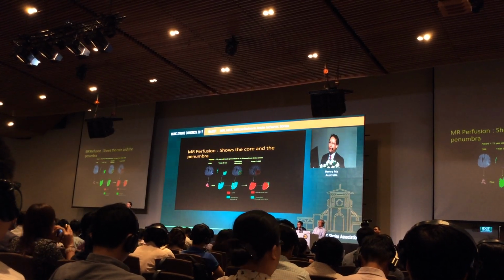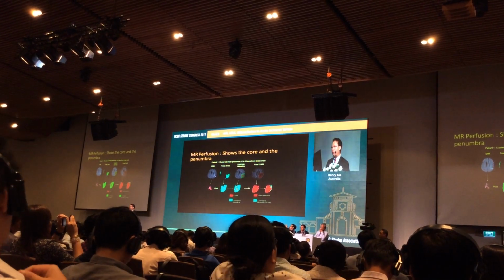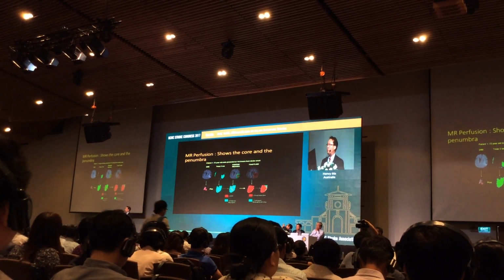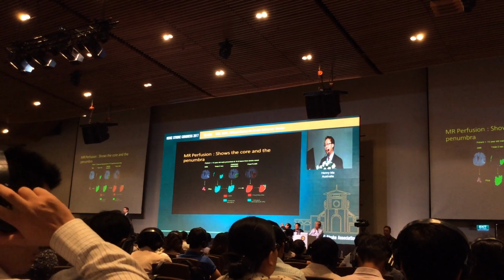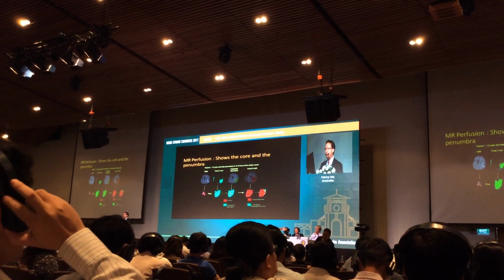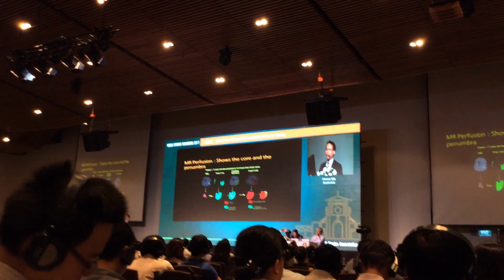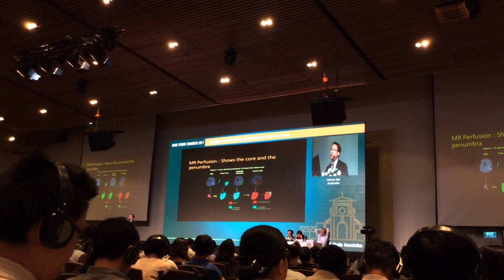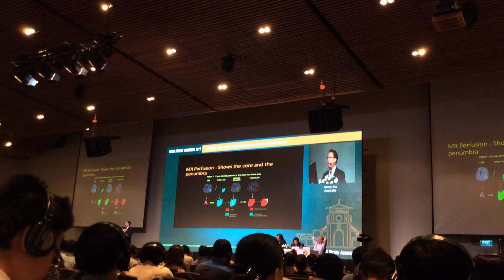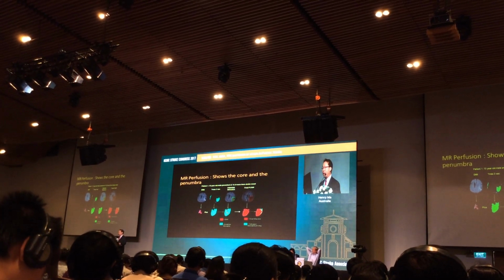So this is a 72-year-old patient using MR perfusion up to 14 hours from the stroke onset. As you could see, we used a more relaxed Tmax value of 2. You can see a large perfusion deficit. As you can see in the middle, there is a perfusion diffusion mismatch of a large area. This patient did not get thrombolysis because it's 14 hours, and 3 months later, you can see the FLAIR infarct completely taking up the penumbra. What you try to save is the penumbral mismatch.